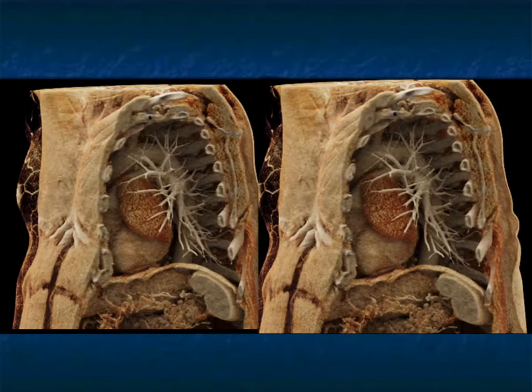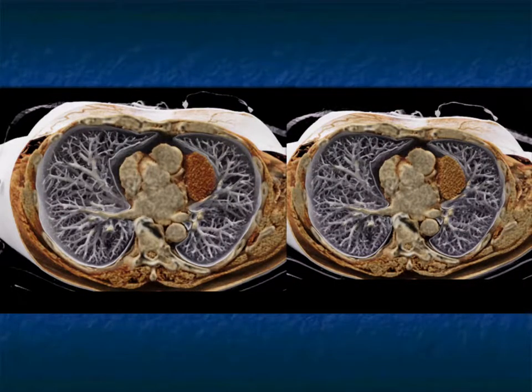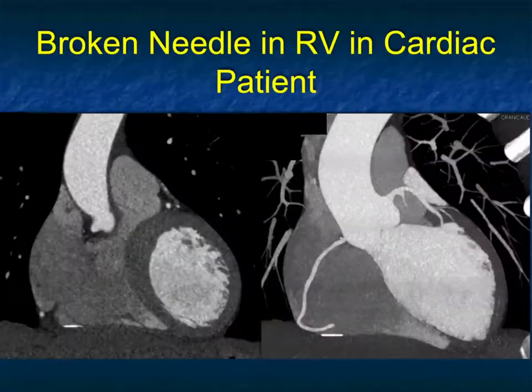And here it is from a sagittal perspective. Again, cutting through the chest wall, giving that oblique lateral projection becomes very, very valuable. And here's the view from below. Again, relationship to the lung, relationship to the cardiac structures, classic appearance for pericardial cyst. This was an interesting case.